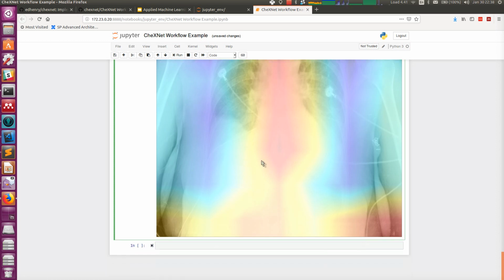So this is an entire functional environment. I just wanted to give a quick overview of how to get this environment functional. And in other videos, I will explain the use case in further detail and start to decompose some of the components that are here to help you understand what all of these parts and pieces do.